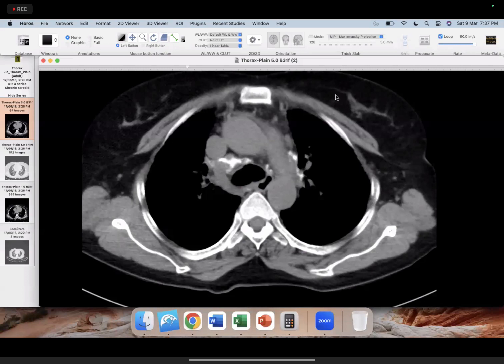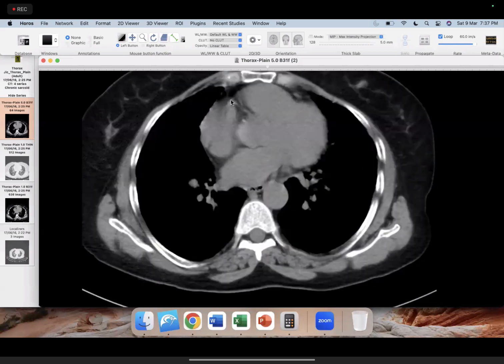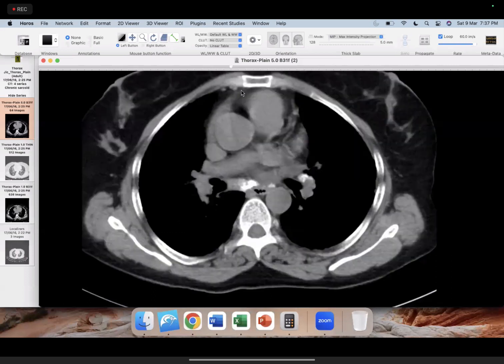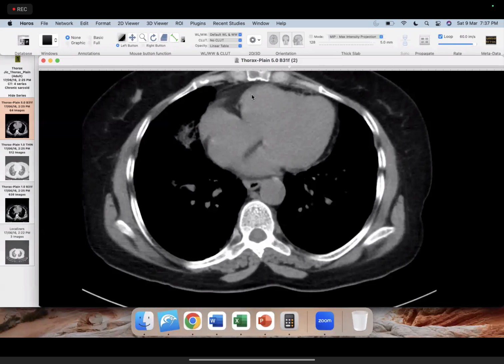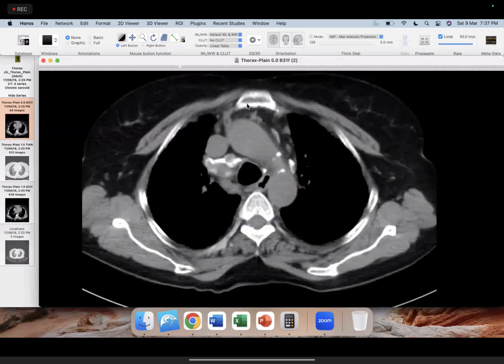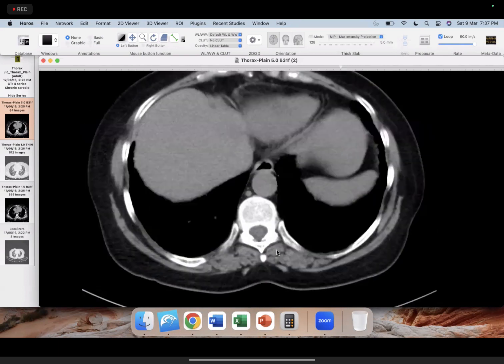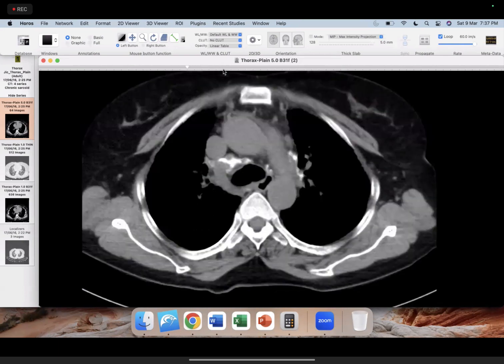So this type of additional information, if you also have it, or you have previous scans from before this fibrosing stage developed, if the patient can pull out a scan 3 or 5 or 10 years back, at the time where there was no fibrosis, you can again see the nodules and make this diagnosis. So look for this additional sign, but even if you are not able to, then at least telling this is not IPF, but one of these two, that is also a job that is half done.